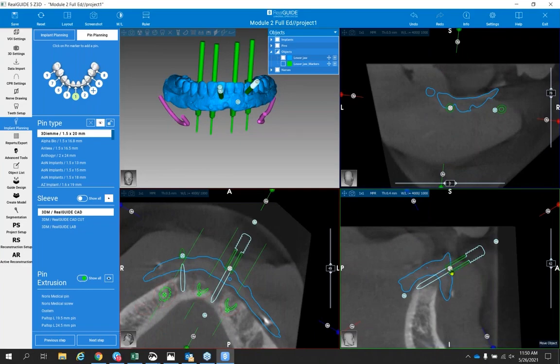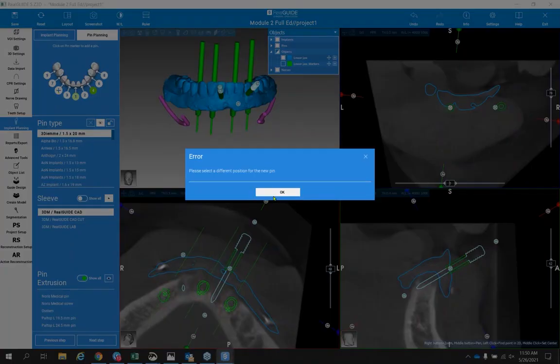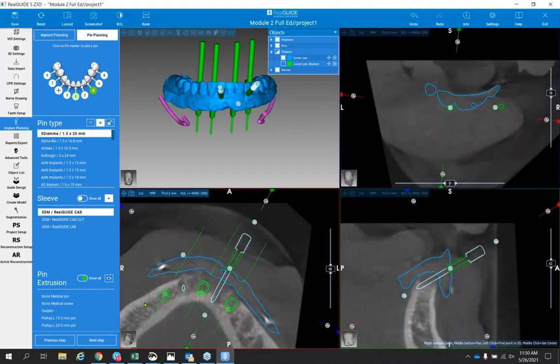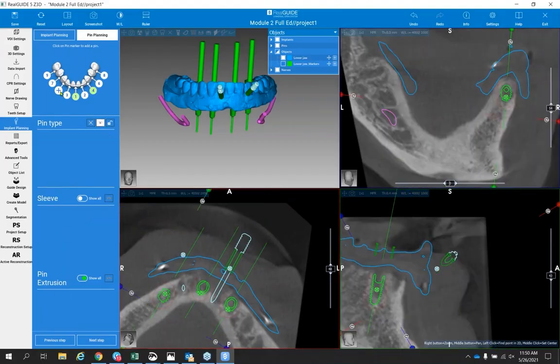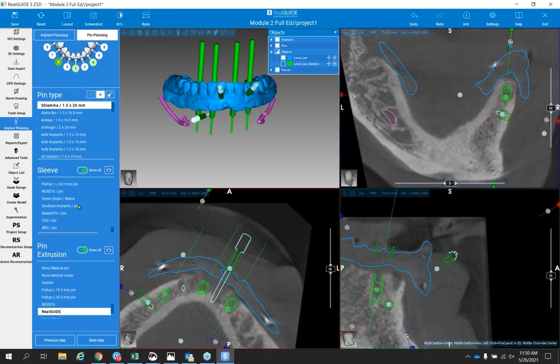All right. I'm just kind of working in one field here. I can bring it around. Now, I'm going to do 5 over here because I want to show you. That's all right. We'll go here, put another one here. We'll call this 5. Again, 3D pin. Let me grab my sleeve. I don't think I grabbed my sleeve on the other one. Here's my sleeve. I thought I had it. And we go custom 3D. There we go. Okay, so let me bring this sleeve up.